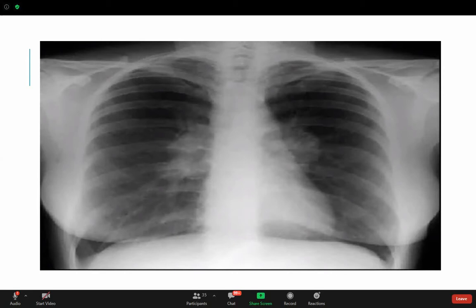I need your help, guys. What do you see? Someone mentioned abnormal hilar.